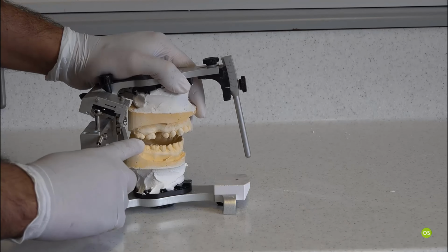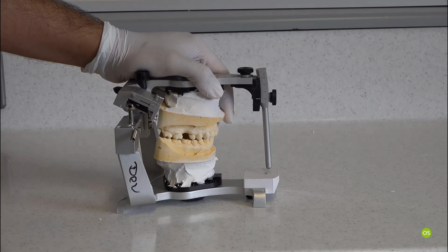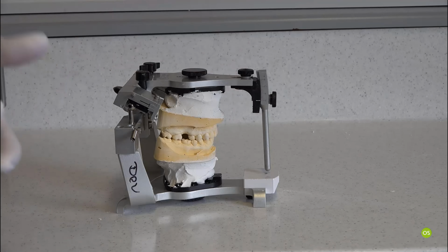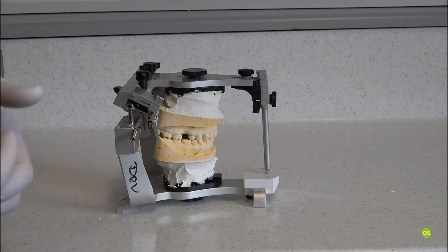Afterwards, what you can do is you can start taking the first point of contact away, and then you can assess where else the contact is going, and you should be able to then assess the restorability of the area, and you should be able to assess, if you take that wisdom tooth out, which tooth will take the pressure.